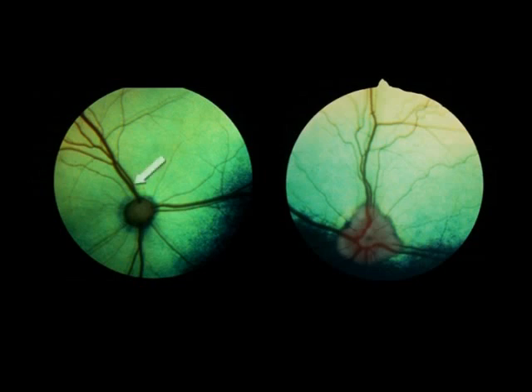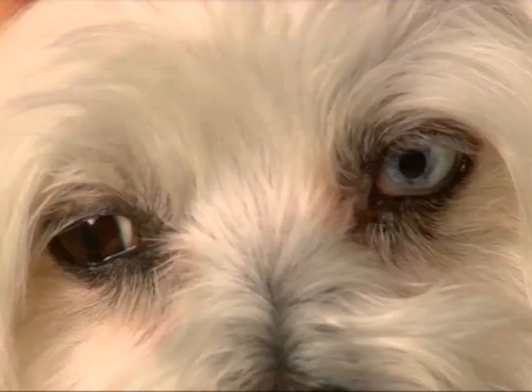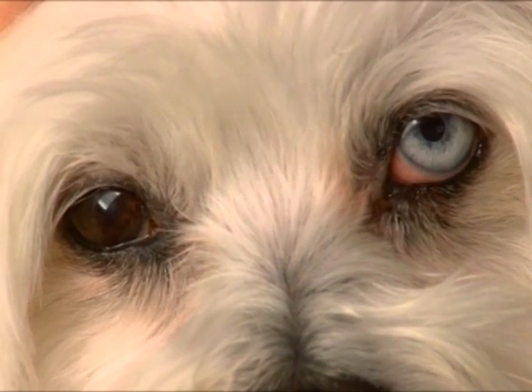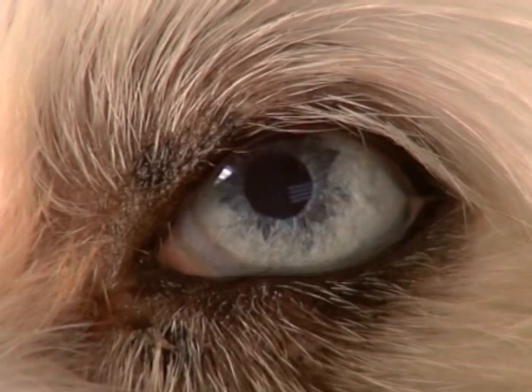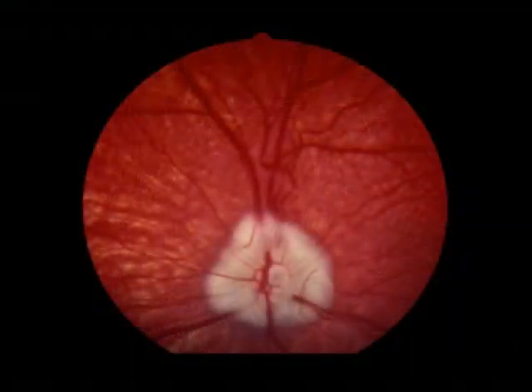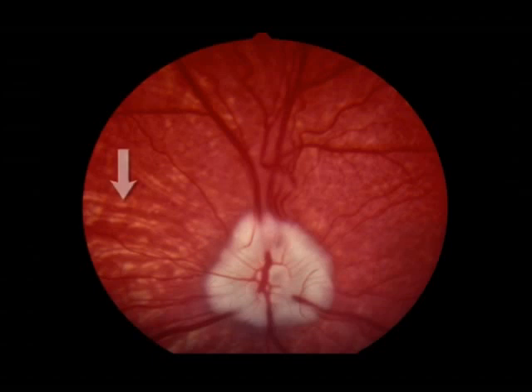In cats, the retinal vasculature is relatively straight and extends into the fundus from the edge of the optic nerve head. In dogs, the retinal vasculature is tortuous and the venules extend from within the optic nerve head. There is also considerable individual variation in normal fundus appearance. For example, in subalbinotic or blue eyes, the tapetum may be absent and the non-tapetal fundus may be non-pigmented. This gives the fundus a reddish appearance, and the choroidal vessels may produce a striped or tigroid effect.